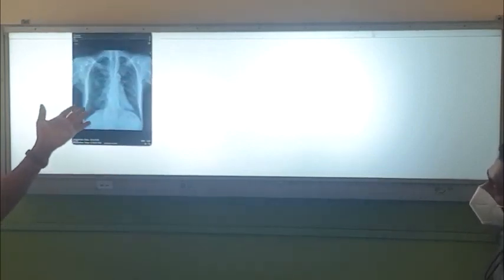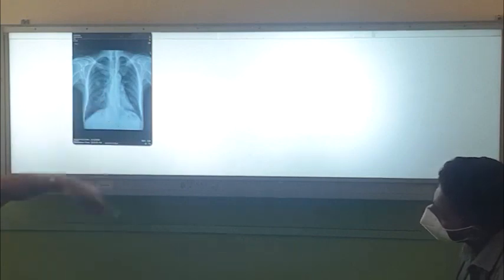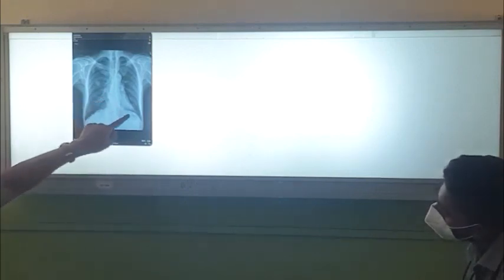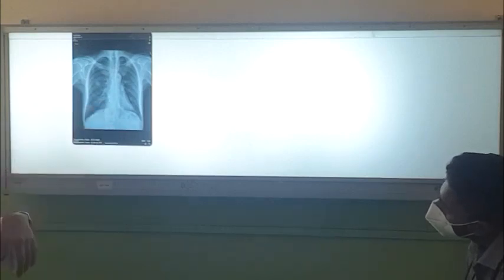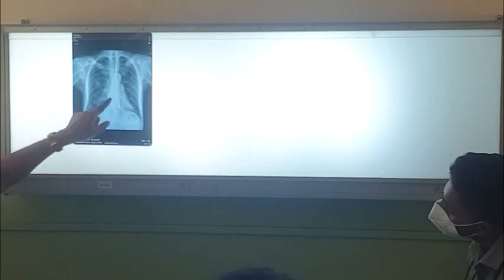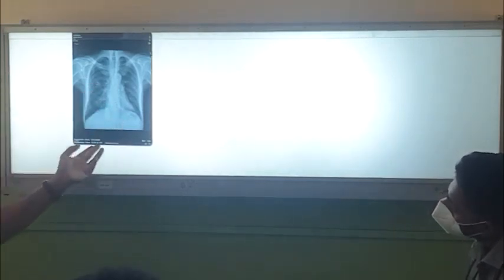This is a patient with CA esophagus who has undergone stenting. So you can get these things in your spots. This is an esophageal stent, and it's coming with a rounded lesion, possibly a secondary deposit. So you have to detect this esophageal stent coming with the secondary deposit there. This is how you describe it.